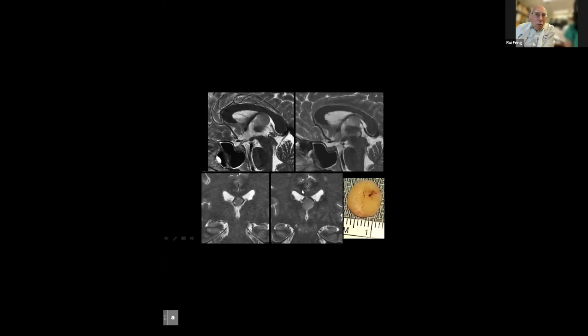They are not always at the foramen of Monro. In this case from Sinai, there was a mass with the fornix above and the roof of the third below that was in the cistern of the velum interpositum, but further posteriorly. The approach was not to Monro, but it was lateral under the fornix at the mid-ventricular body. And this is what was found.